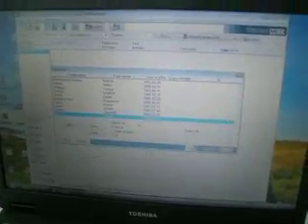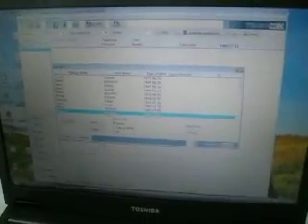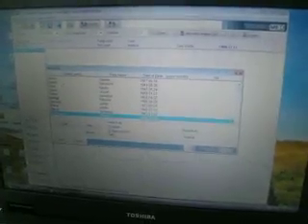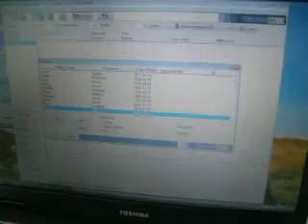You can also use a more sophisticated search function like here. It not only searches in the family name but also in the first name. So if I would like to search for Andrea, it will give you Andrea wherever it finds the first instance of Andrea. You can also search for date of birth or ID number. You can delete or add a new patient, or you can select an already defined patient to be your default patient for the next measurement.